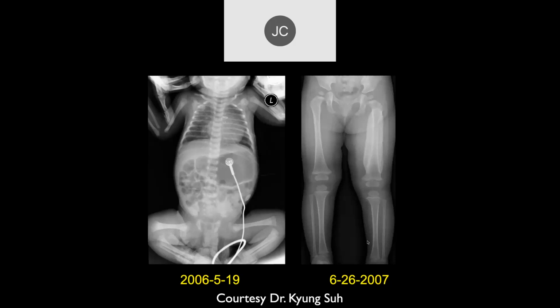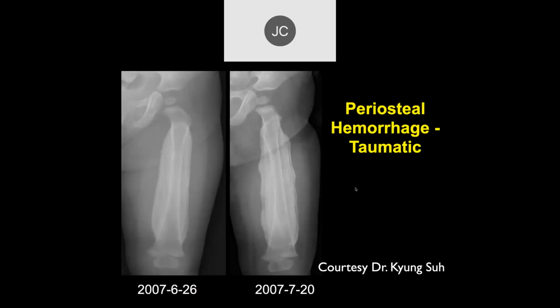Around the left femur, I think there's this lifting of the periosteum with a hematoma around it, given the history. So it's a classic chronic periosteal hematoma, and you can often see a laminated appearance due to intermittent bleeding and not bleeding, and that calcifies.